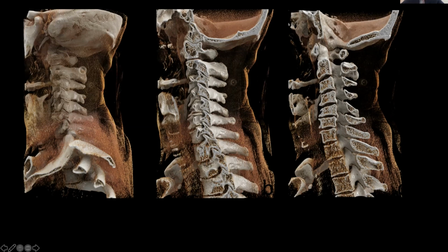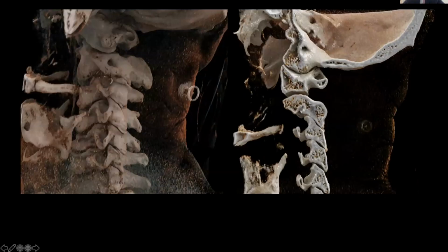On the other, looking laterally, you have concave into convex, which allows for anterior and posterior rotation. So that's a very clever mechanism, which you wouldn't necessarily see without the 3D depiction.